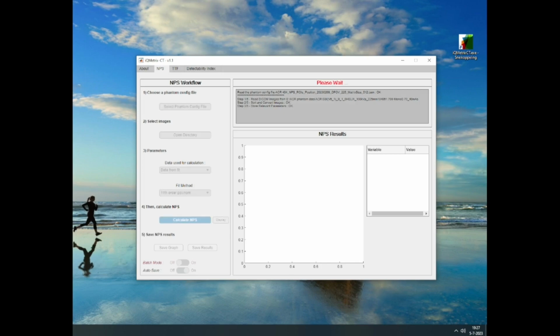Maybe I have to do something. Yes, now it's calculating. Please wait again. When it shows something with log something, then you know that the calculation has been finished. So we have to wait a little bit for this again. The results are saved. Ok.